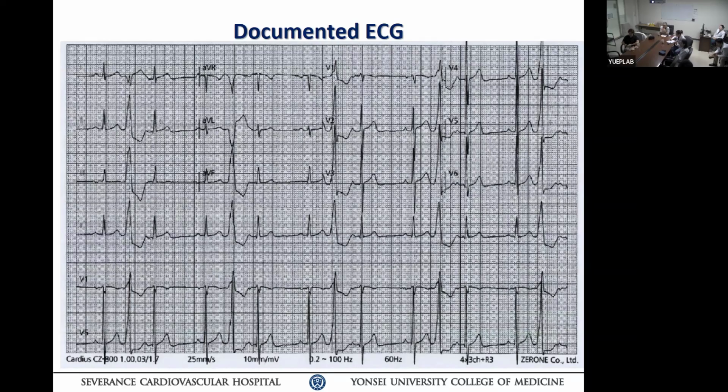Now, what does this P wave do? Did you measure the P interval to the QRS complex after that? Is there any P wave? Do you see anything? Do you see any retrograde P wave? I'm asking.